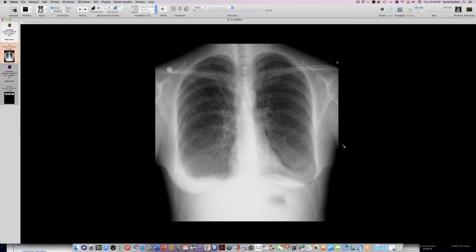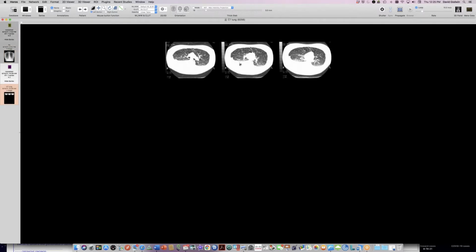And this is a woman who has these ancient chest radiographs from the late 90s showing pleural effusion. She had a variety of presentations with pleural effusion, sometimes one side. In this case, at this time, it's both. She does have this kind of reticular abnormality up here. She's got normal lung volume, and she has lymphangioleiomyomatosis. And maybe I can enlarge these images here for you.